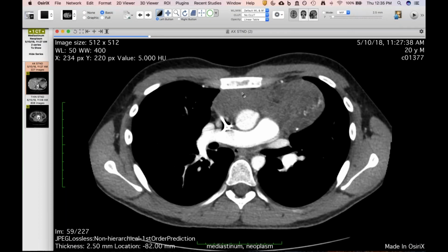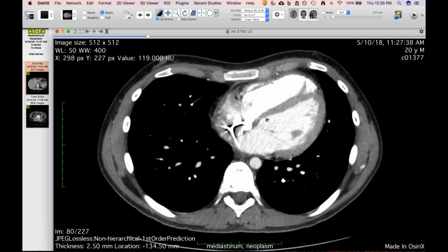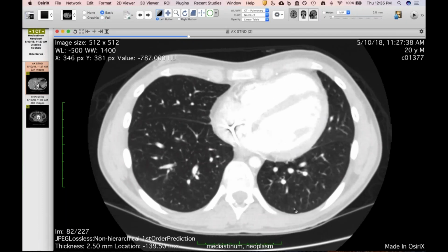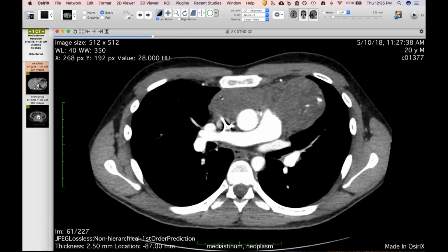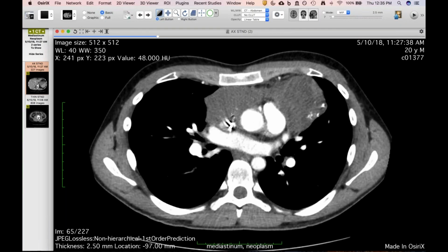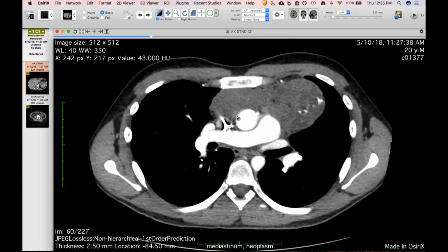But there's two things. A, you have this over here, which is more just infiltrative soft tissue, which looks like it's contiguous here. And then also he has a metastatic nodule in his left lower lobe, and he actually presented with brain metastases. Gosh. And yeah, so they biopsied this, and it was all immature elements. His AFP, his alpha fetoprotein, was elevated. His beta HCG was elevated, and they did a core biopsy, and they got some sort of mixed germ cell tumor.